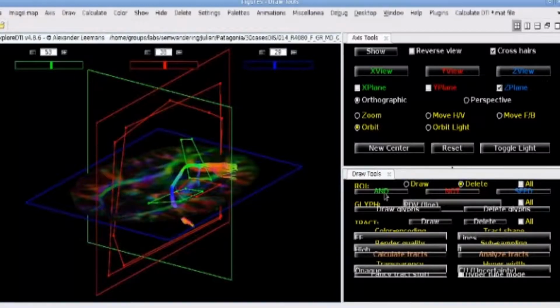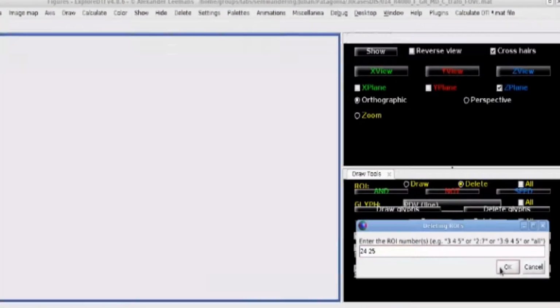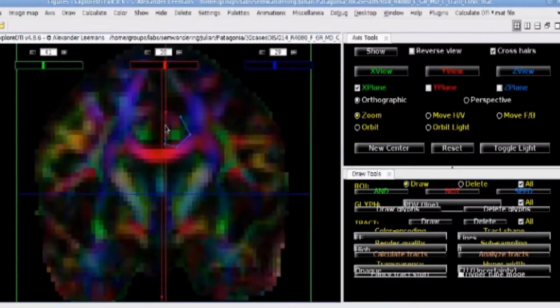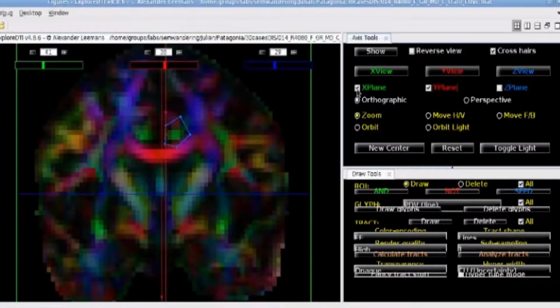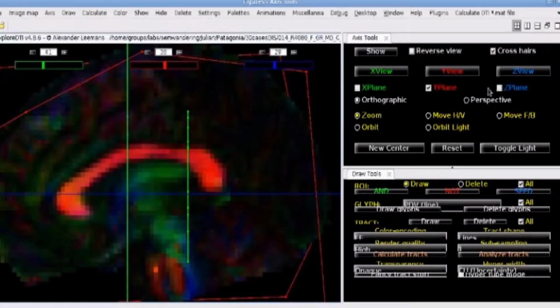And it's important that we save the 30 cases and the region of interest, and we can process by batches. 30 is a nice number.